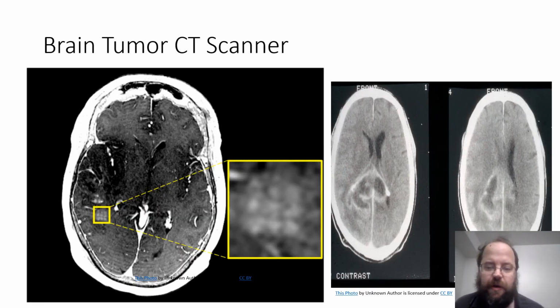You see here the brain tumor on the scanner. They've enlarged and enhanced it for you so you can see it, with and without contrast. Iodine, again: when they start an IV on you, if you have an allergy to iodine or shellfish, let them know, because contrast is based on iodine, warmed quite often just to enhance absorption. But you can see there's the brain tumor.